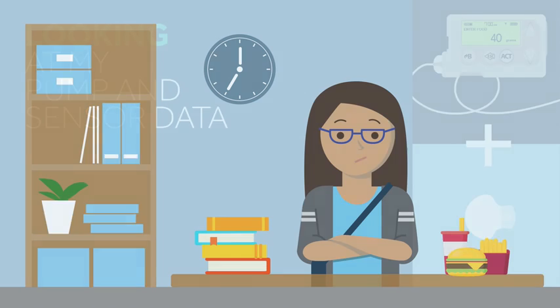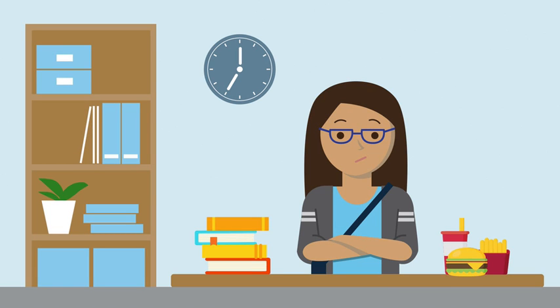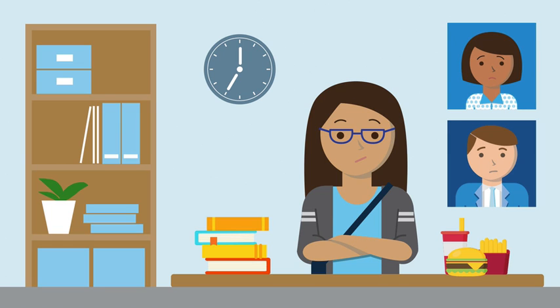It's finals week at the university. Sophia has been doing a lot of last-minute studying for her tests and resorting to eating a lot more fast food than usual. This is her first year in college, and her parents worried about what would happen to her glucose control while she is away.